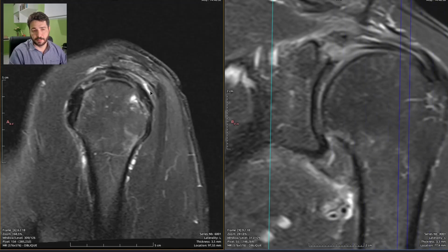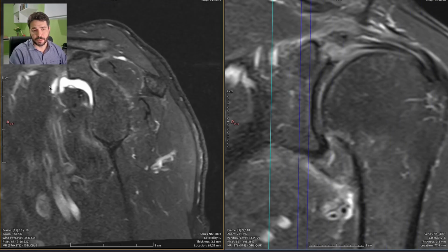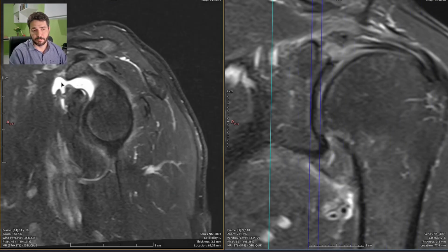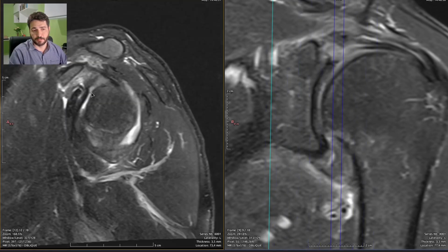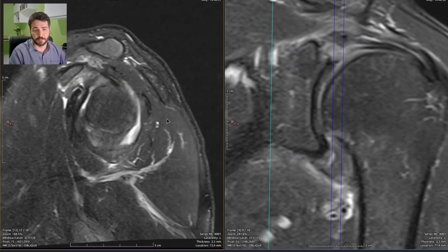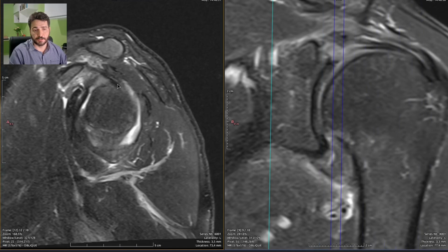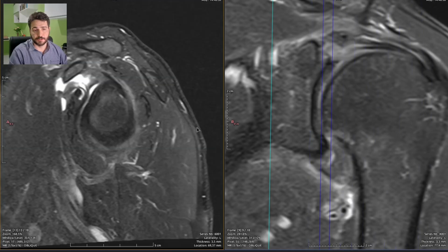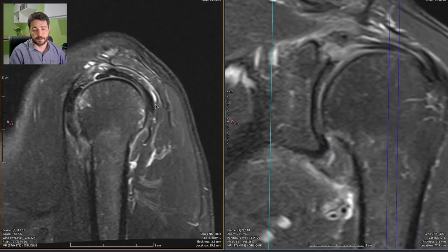sick. There is really a bursitis here, a subacromial bursitis right here that communicates with the articular joint, of course, as is most common, and there is an articular effusion, and that biceps tendon tear reaches the anterior and superior portion of the glenoid labrum.